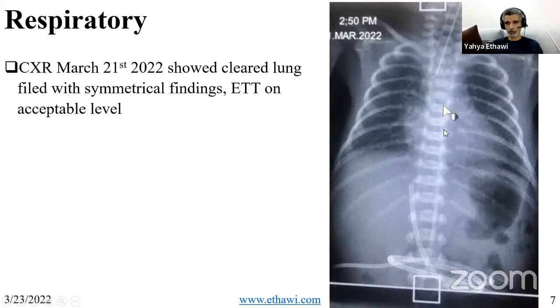There is no feeding tube, that's a mistake. And the UAC is in an acceptable position, although a bit high. The UVC is not in a good position, so it probably needs to be pulled or something done. Any question about the X-ray?